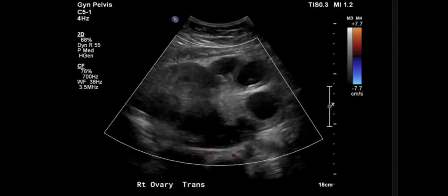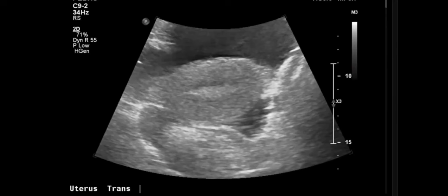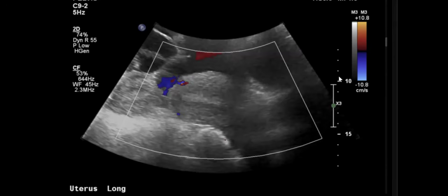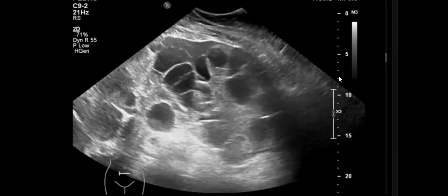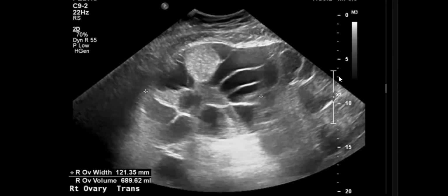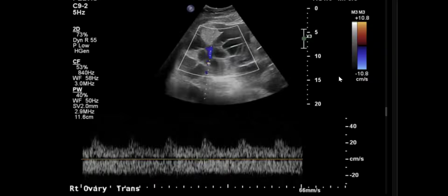Okay. I'll give you another case of the same category. You can scroll. I'm presented with axial images of ultrasound in a middle-aged female who presented with acute pelvic pain. The images are jumping. Sorry, my internet today is not good. I can see massively enlarged ovaries. The ovaries have multiple and large follicles, some of which are showing fluid level and hemorrhagic component, and then stroma.